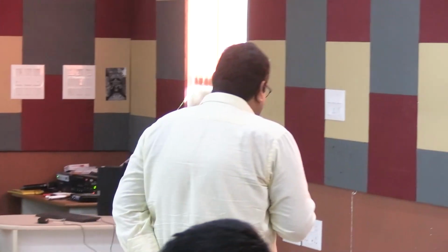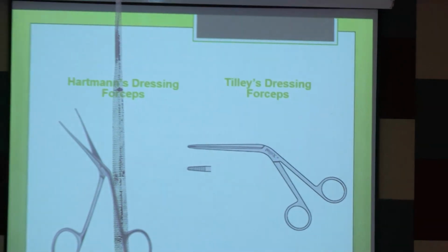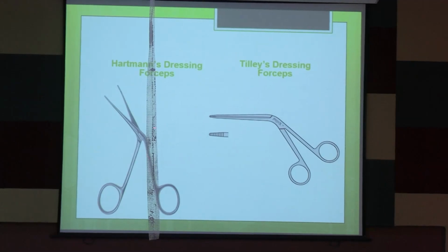So in ear surgeries or in nasal surgeries, we use this instrument. It's part and parcel, a very important instrument. Okay? We use it. Again, the one that was wrong earlier, okay? This one is Tilly's, this one is Hartmann, right?